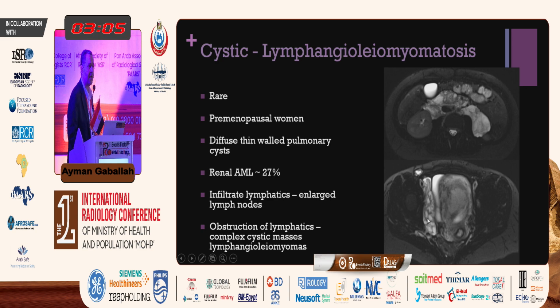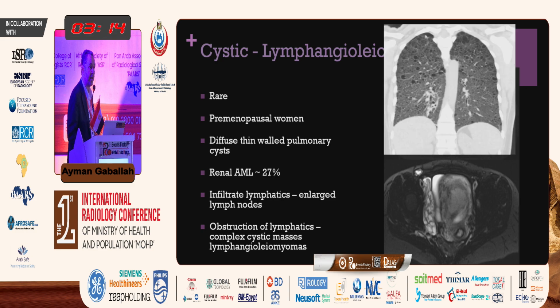And we were not sure what kind of mass this was in a pregnant lady like this, until the patient during admission had some chest pain. Then we got a CT chest for assessment, and we found so many cystic lesions in the lungs, and also a tiny pneumothorax here in the right apex. This is typical for LAM, right? This kind of change in the lung in a young female in the childbearing period.